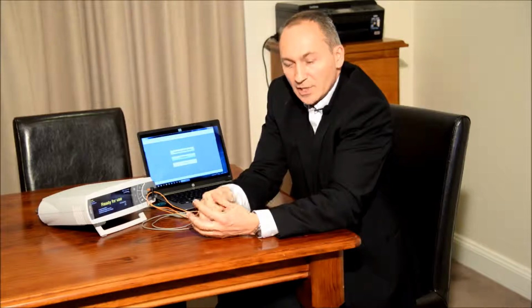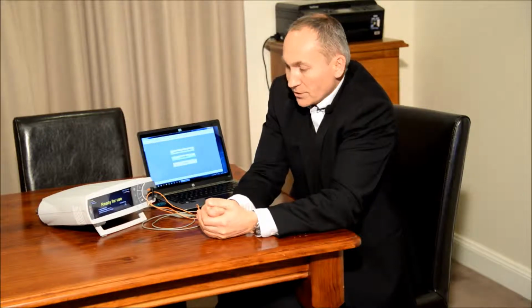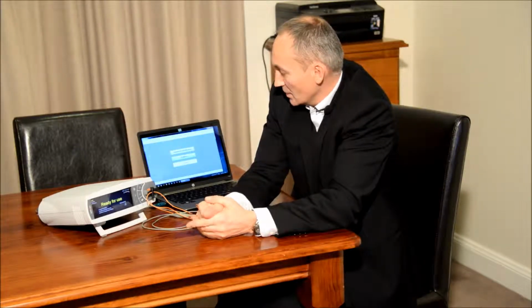If you haven't done that yet, go back to the previous video and have a look at that. It's fairly easy and fairly self-explanatory, and so far we haven't had any problems with customers setting those up. But once you've got all three things, the cable, the Centec SDMS, and the computer loaded with VStats software, then the rest is just connecting it up and running the software. So let's do that, shall we?